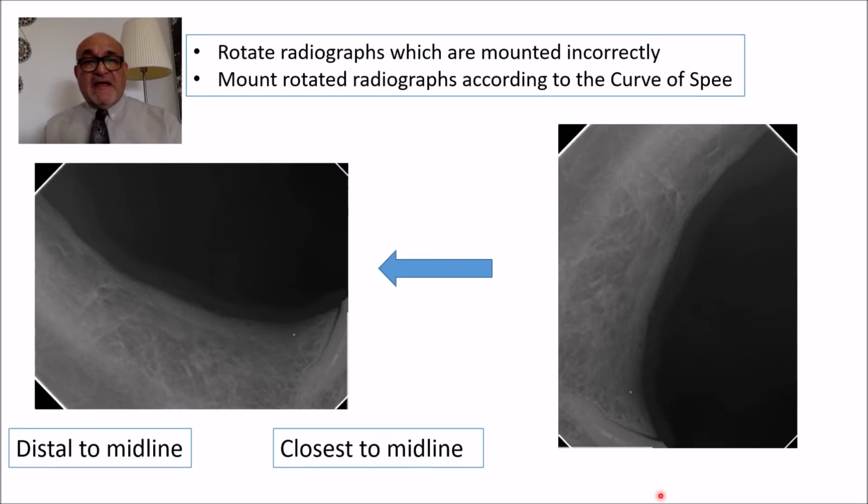Okay, another edentulous area, which is flipped by 90 degrees. First of all, is this the mandible or the maxilla? Do you see any trace of a maxillary sinus? Do you see any trace of the nasal fossa or the inverted Y? No. All of these are not present. So this is the mandible.